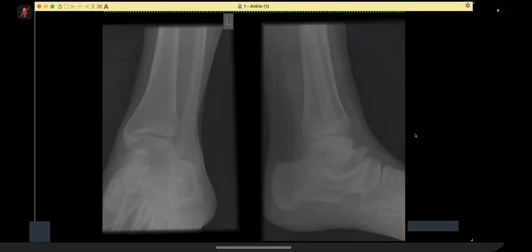In conclusion, there is an increased density sclerosis of the medial aspect of the talus. I can also note a similar sort of sclerosis and added density outlining the margin of the calcaneus laterally. There is also a significant soft tissue swelling adjacent to the calcaneus in that region. I would relay my findings to the clinicians and correlate with the clinical history. I suspect this patient will require cross-sectional imaging in the form of a non-contrast CT to characterize these findings further.